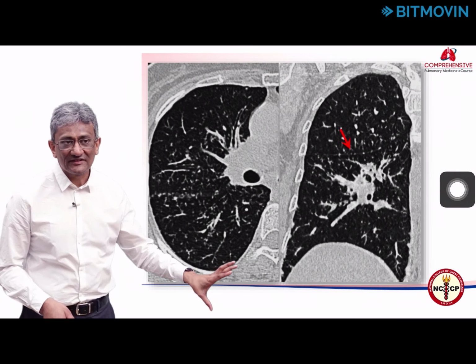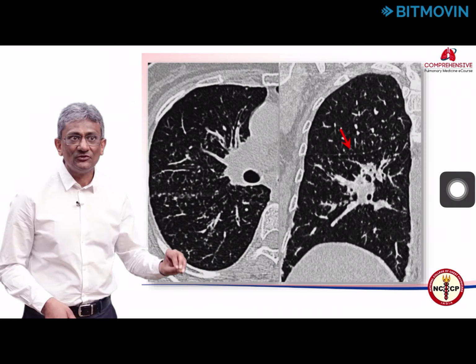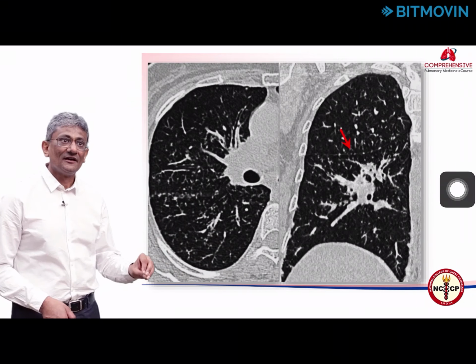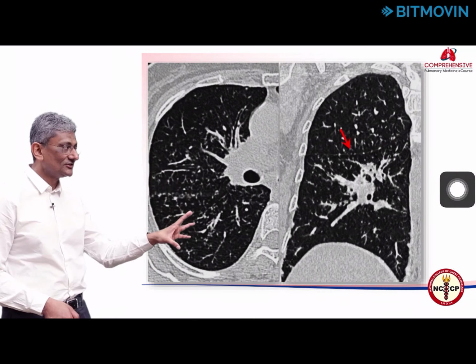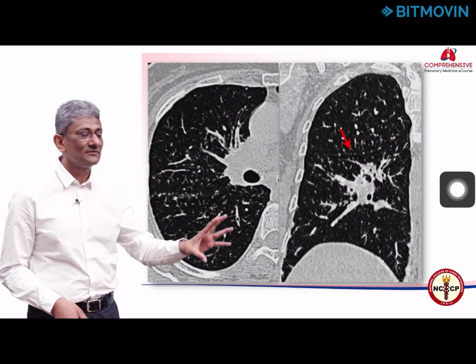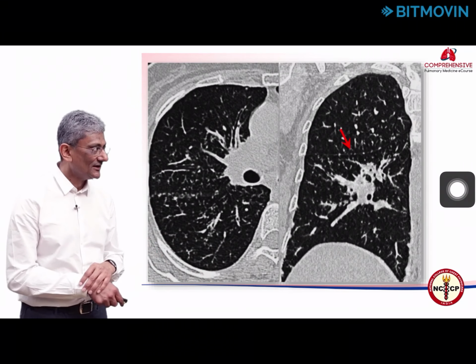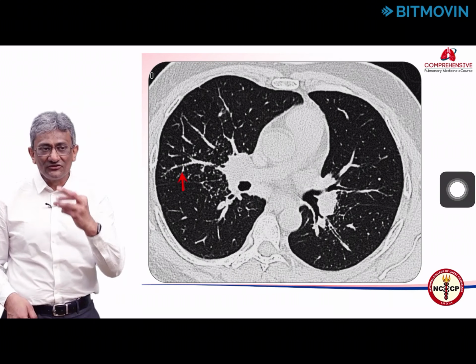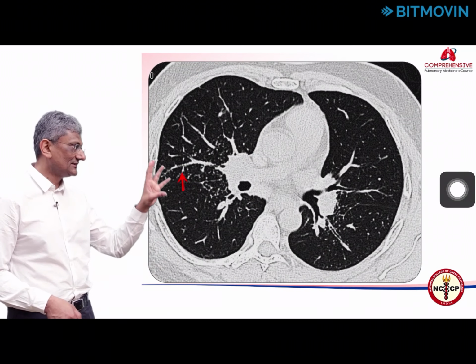In patients with sarcoidosis, or sarcoid for short, we see subpleural nodules very well along the fissures on coronal images. So, here you can see perihilar nodules on the axial image, and the coronal image clearly shows the fissural nodules really well. Sarcoid nodules in the lungs start in the perihilar region as a rule.